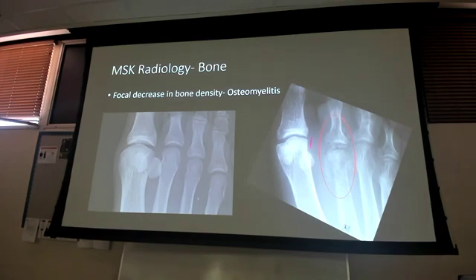But the big red circle shows the osteomyelitis starting. Compare it to the normal on the left. Look at the degradation of the bone. Look at how it's starting to eat away. Most of the time, it actually starts near the joint because it's easier for the bacteria to get into that area. What type of patient do you think this is?